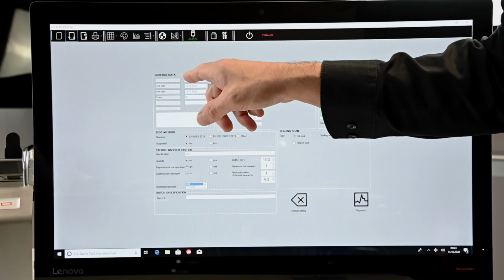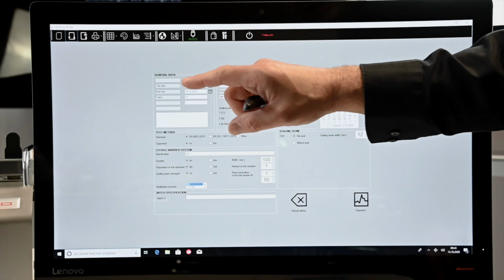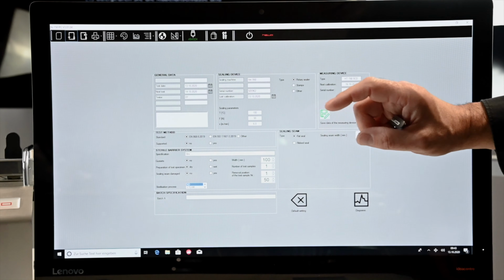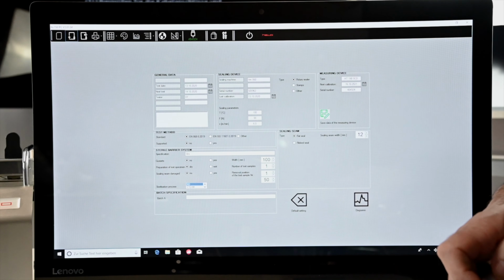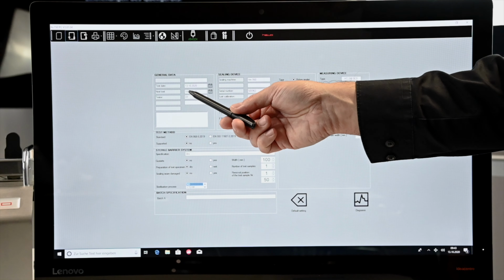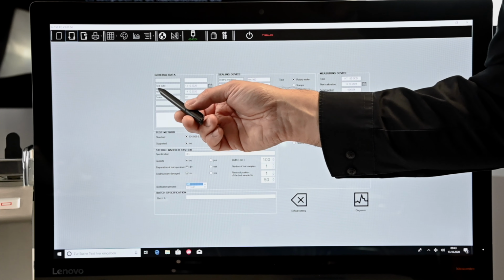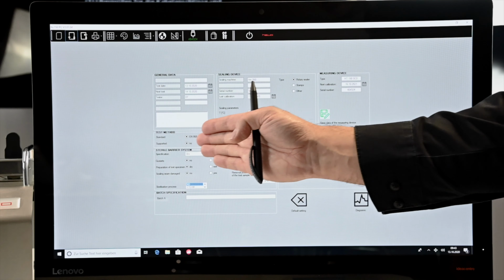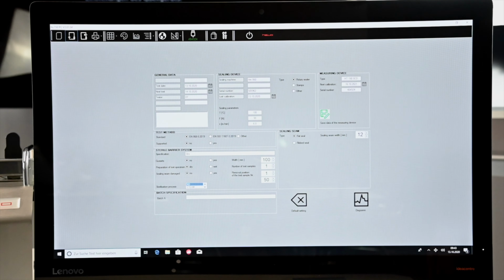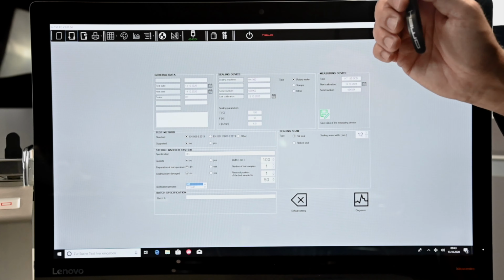First of all, the testing date, and we will choose today's date accordingly. Optional, a next testing date that we chose as tomorrow. Information on the tester, here I abbreviated my name. Optional, additional information on customers or the company. Information on the sealing device.